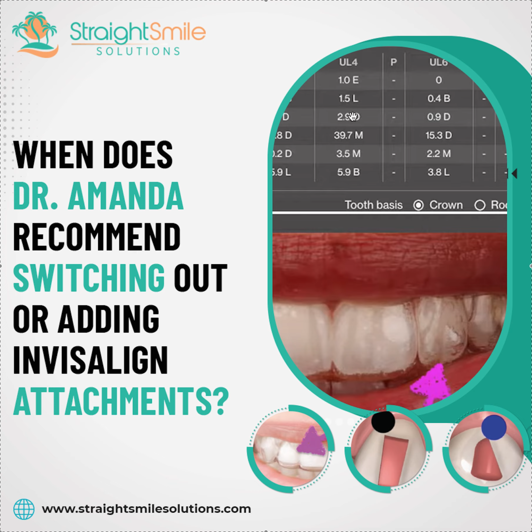Then after I look for the blacks and blues, I go up to the TMT, tooth movement table. My eyes are pretty trained. If I watch an animation, I can see if there's movements that seem strange, and maybe are less than predictable. And then I make sure I have a really large attachment on it.